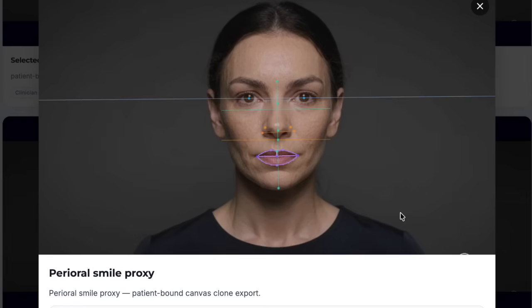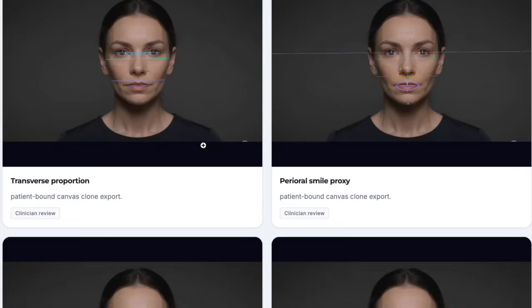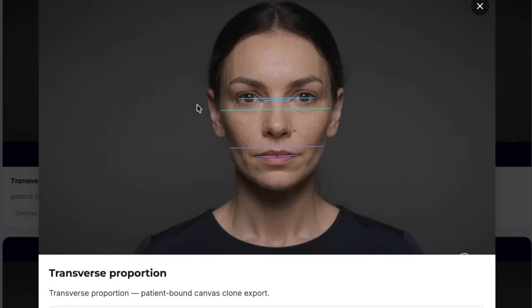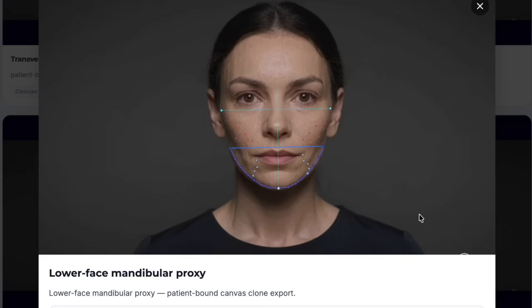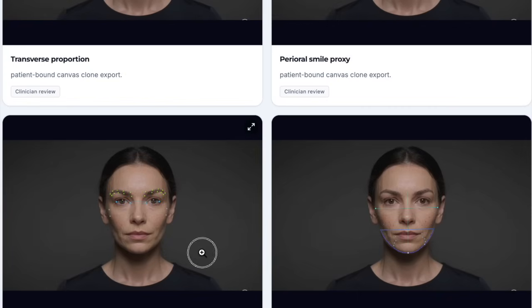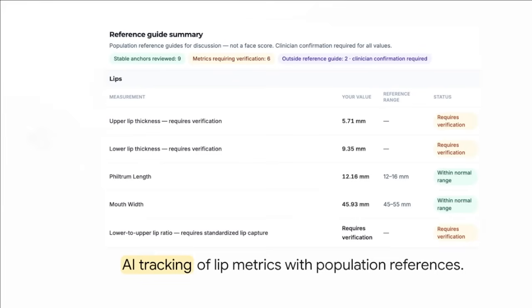So the AI automatically synthesizes these isolated data points. It flags when metrics, like midline deviations, fall outside normal bounds, and generates a clean, pre-formatted clinical observation card. The system calculates its own certainty and explicitly requires human sign-off before any medical conclusion is drawn, a framework known as clinical decision support. It even grounds its observations by attaching peer-reviewed PubMed literature directly to the flagged anomaly.